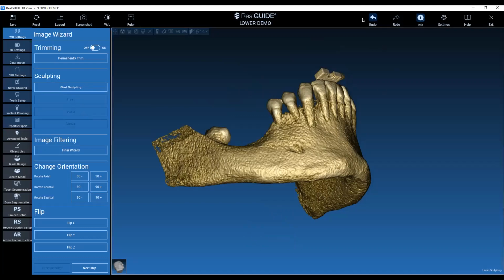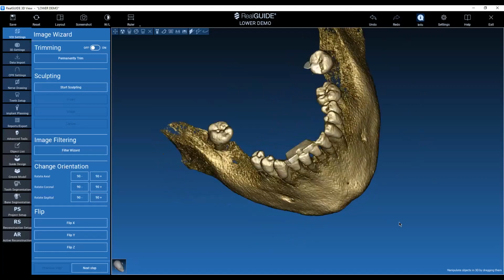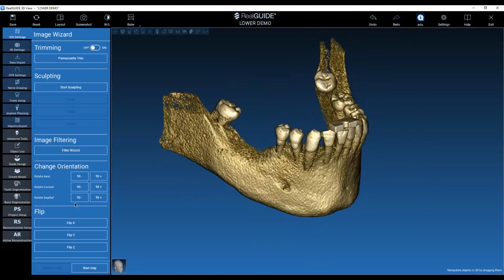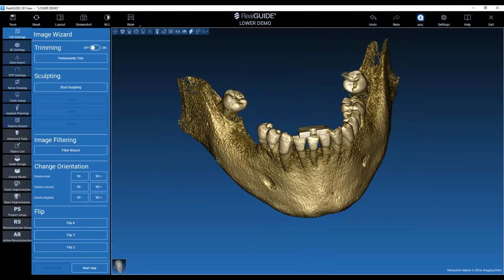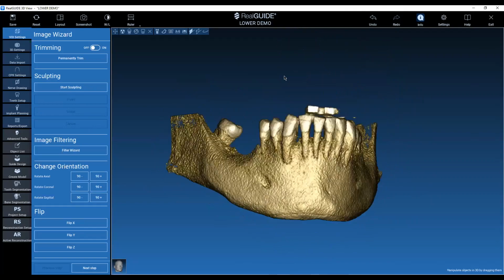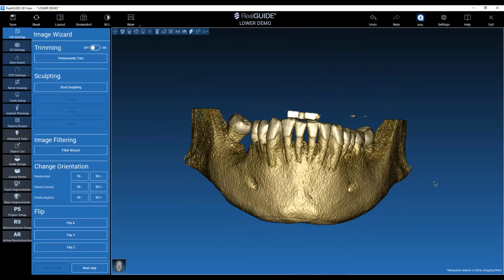Okay, as you saw, I've used the undo here to go back to the previous situation. The second part of this screen is not widely used. It's used to flip the direction of the images, I mean, when the radiologists do something wrong with the tags assignment, you know, tags upper, lower, right, and left.